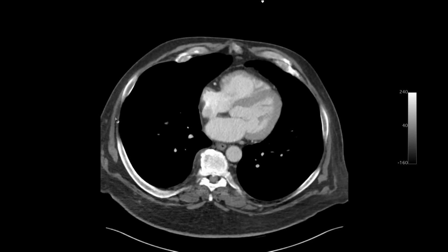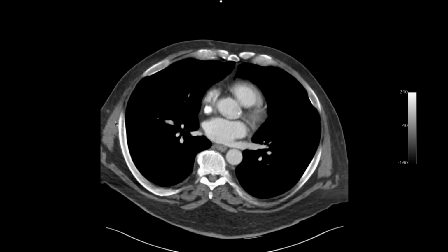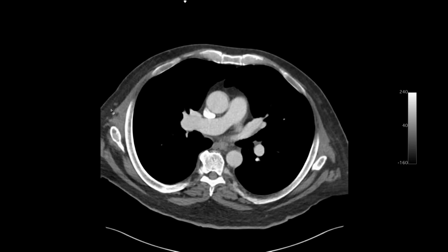Sometimes residents ask me, this is a CTPA, we didn't really opacify it. Now it's not this particular case, but this is the kind of case where the pulmonary artery wasn't opacified very well. Do you think we should repeat it? So here, if we actually measure, some people are pretty rigid about 200. This one is 155, as you can see there in that range, and use that number.